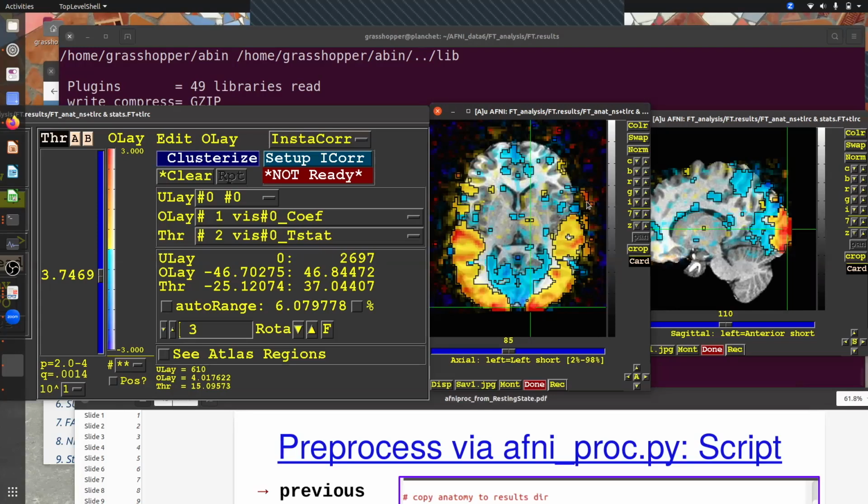And again, there still is just noise. So purely random things, even here, this is above the threshold out here still. Our data has been smoothed out there and some other things, but data is really, really noisy. So what do we do to improve our studies with fMRI? We don't just scan one subject and say, these are the parts of the brain doing it. We scan 10 or 20 or 1,000 or more, and we pool all those results, and those will sharpen our statistics. Those little random bits that appear at the edge, those are random in every different subject, and those fade away when we combine the data.